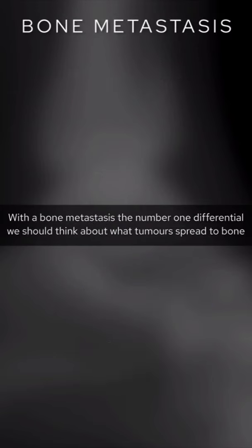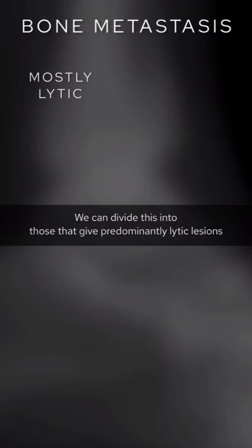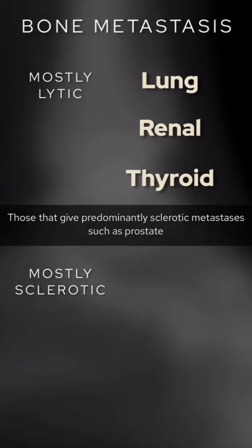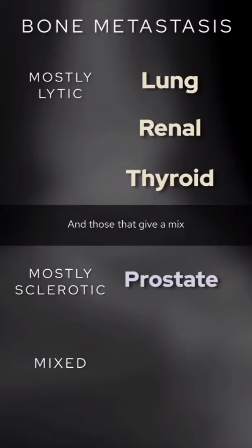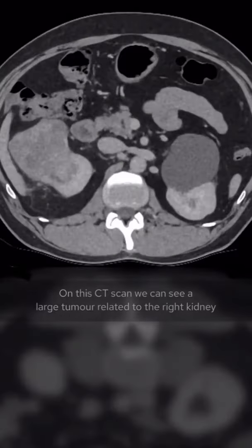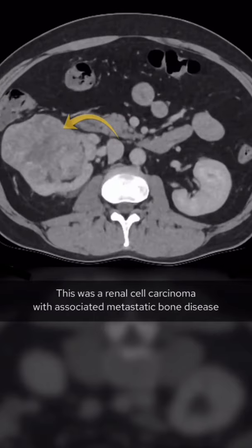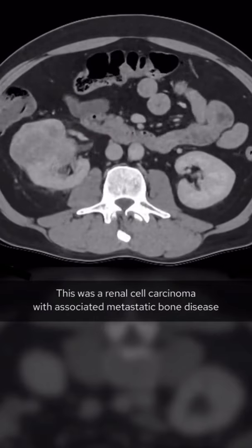With a bone metastasis, the number 1 differential, we should think about what tumours spread to bone. We can divide this into those that give predominantly lytic lesions such as lung, renal and thyroid, those that give predominantly sclerotic metastases such as prostate, and those that give a mix, and here we have breast. On this CT scan we can see a large tumour related to the right kidney. This was renal cell carcinoma with associated metastatic bone disease.